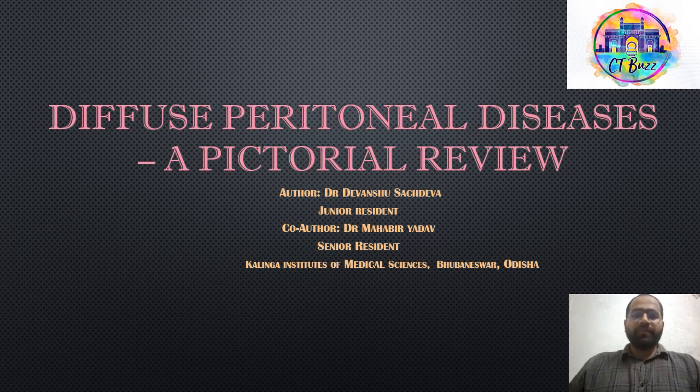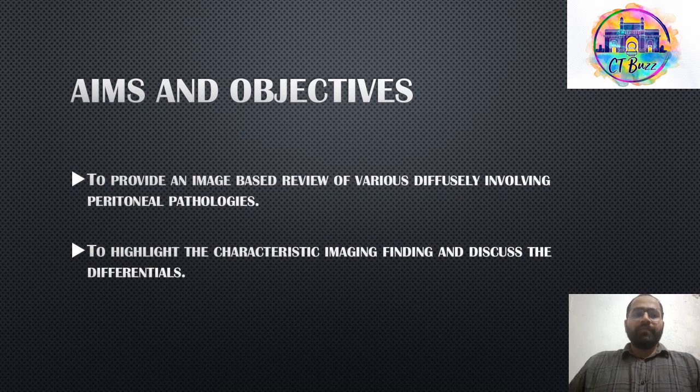I am going to present a paper on diffuse peritoneal disease, a pictorial review. Coming to the aims and objectives, it is done to provide an image-based review of various diffusely involving peritoneal pathologies and to highlight the characteristic imaging findings and discuss the various differentials.